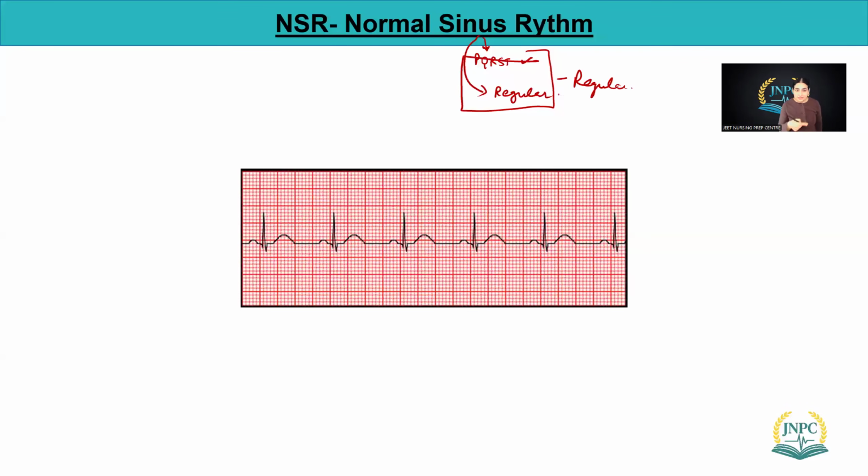So let's see if we can figure out where we have PQRST. Can you look at P wave? There's one. There's another one. P wave, P wave, P wave. So before any QRS, we have P wave, right? And then we have QRS.